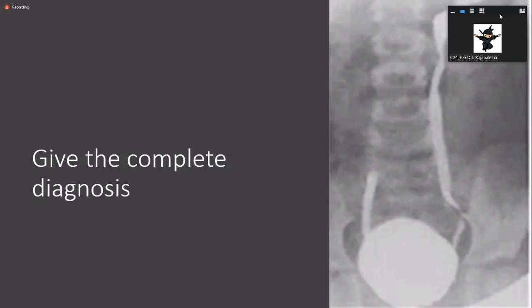Bilateral vesico-ureteric reflux. Bilateral reflux, and the grade? Is it the same on both sides? No. Grade 4. Grade 1 in the right. Okay, right kidney, right side, and then the grade on the left side? Grade 4. Right?